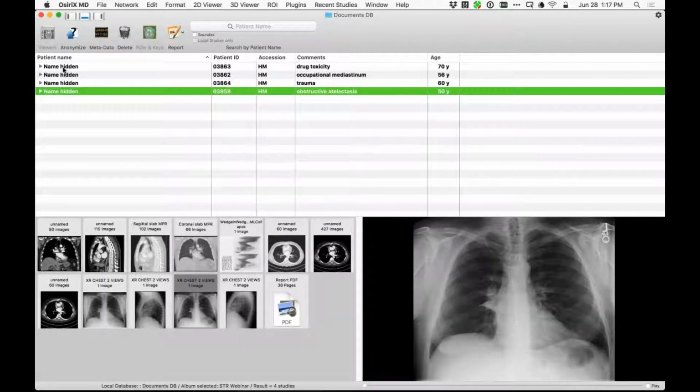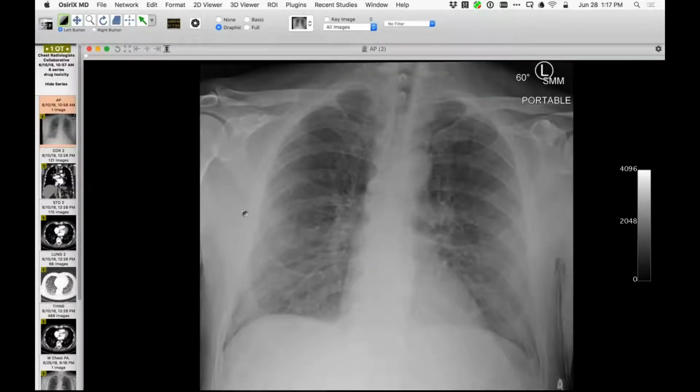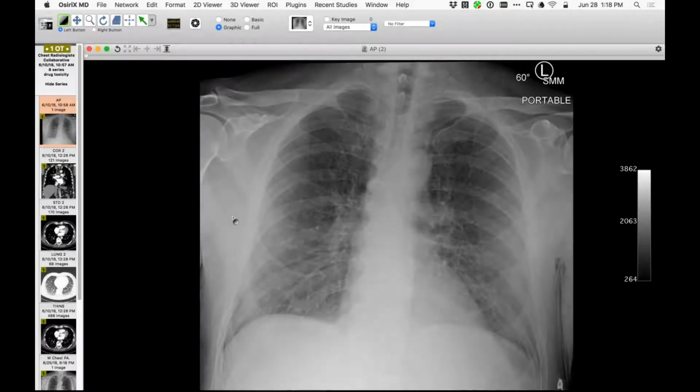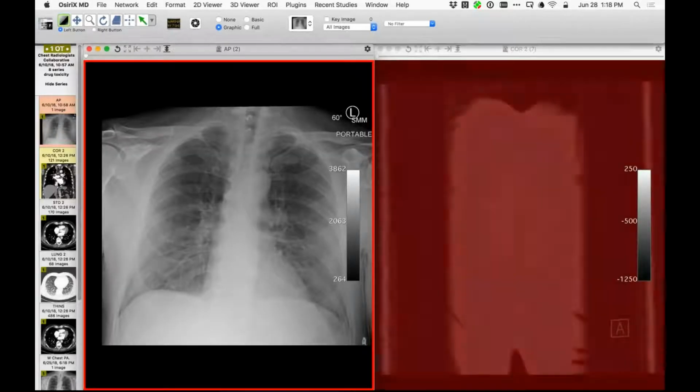All right, let me show you this one. Very interesting case. A person comes into the ER short of breath, not sure exactly what other symptoms, and to no one's surprise, one of the things they did subsequently was the CT, which I'll show you. This is the kind of radiograph where it's really hard to describe. You sort of sense that maybe the lungs are not really normal, but one sees the vessels quite nicely. So perhaps there's ill-defined opacities in the lungs. And there are indeed, because the CT was obtained just a little while later.